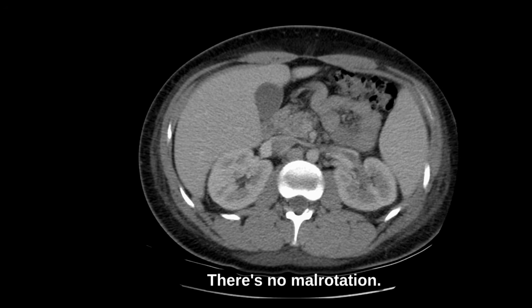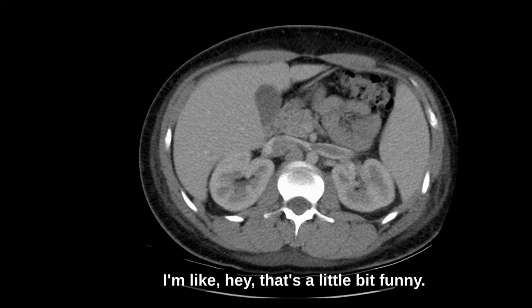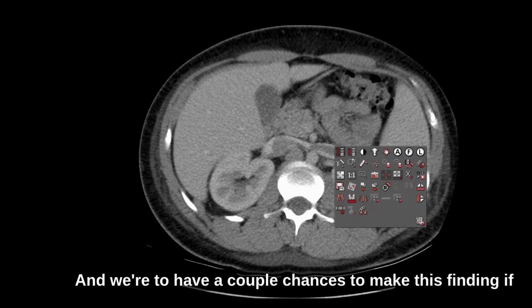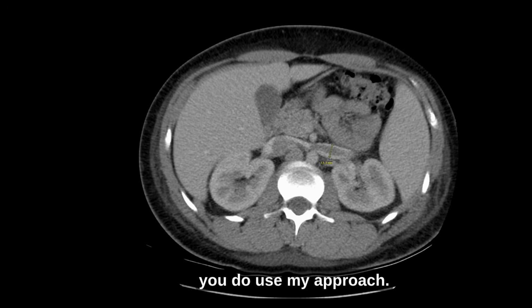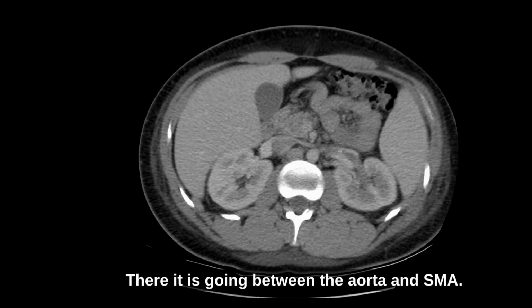There's no malrotation. But when I'm coming up, I'm looking at that left renal vein, I'm like, hey, that's a little bit funny. Maybe you guys saw this, maybe you didn't. And we're going to have a couple chances to make this finding if you do use my approach. But we have the left renal vein here. I'm going to tell you it's a little bit dilated. There it is going between the aorta and SMA.